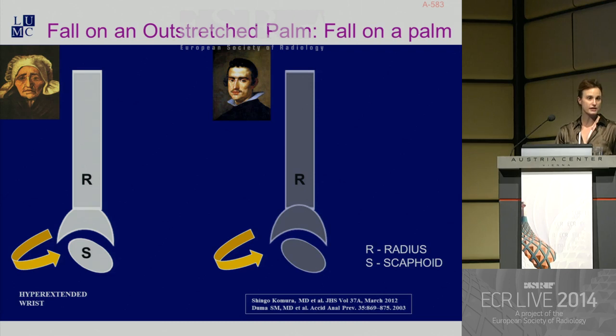In an old lady, there is a diminished bone density at the level of the distal radius, and sometimes due to this, the impaction of the fracture is stopped at the level of the distal radius, and there is no transmission of the force distally.